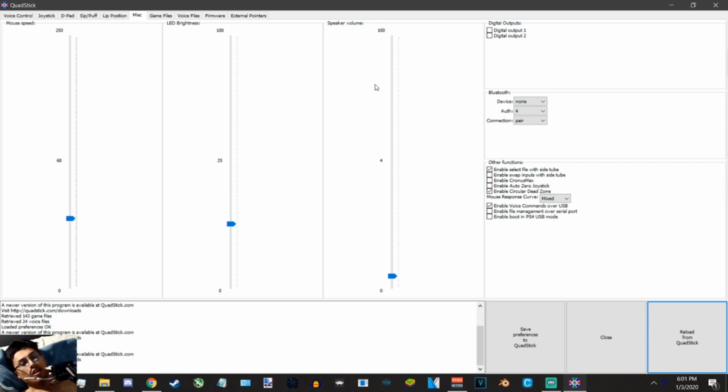But I already know what I'm doing, and I know what noises it makes. So I lowered mine all the way to number 4. All the way down here. I still like hearing it because it lets me know when I'm changing modes. It's still good to know. But it's not distracting at all. It is perfect. I can still know what's happening. Sometimes I change to the wrong mode. I instantly hear it and I change back. Or I delay latch something. So yes, it's a sweet spot right down here.